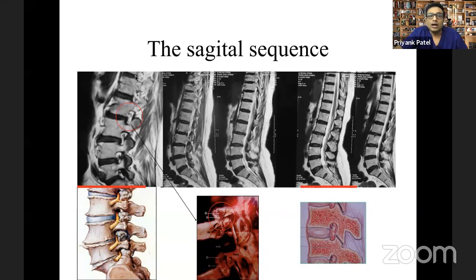On the other hand, the parasagittal section will be able to show you the bone, the pedicle, and the facet joints, and in between two bones you will see this hole which is called a keyhole from which the nerves go. So you take up the T2 weighted image. In the T2 weighted sagittal image, identify the right parasagittal, the left parasagittal, and the mid sagittal section. And then you start dissecting further. In the mid sagittal section, look for alignment, look for quality of bones, look for quality of disc, look for the nerves, and see if there is any compression at any level. Also see if there are any other red flag conditions that you can identify. All right.